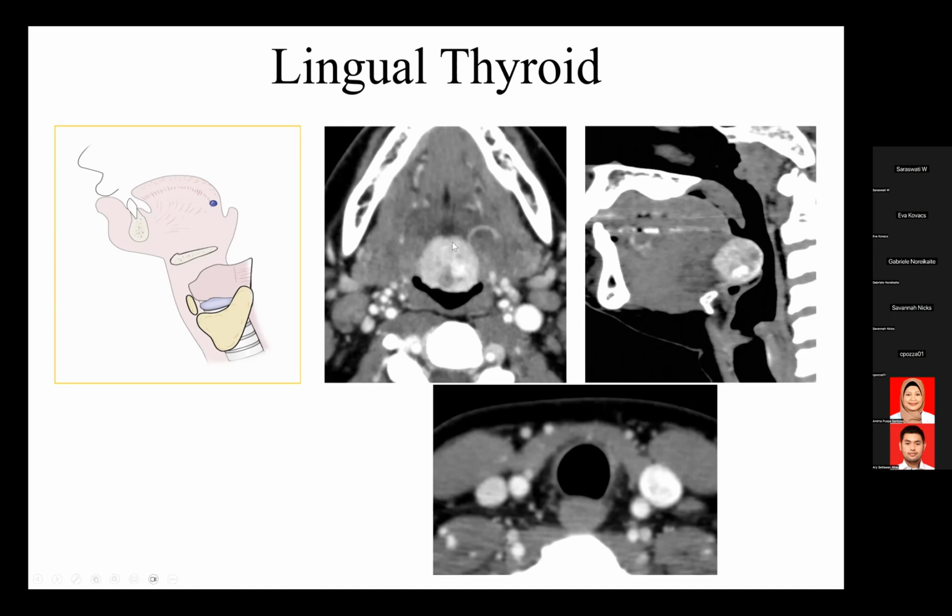So this does not look like squamous cell carcinoma. The few that I've seen in the clinic tend to be polypoid masses that tend to have a reddish hue and almost look like they're hypervascular at endoscopy. And the reason that's the case is that we know that the thyroid gland typically enhances with contrast. So this is an example of a lingual thyroid gland that's located right at the foramen cecum.